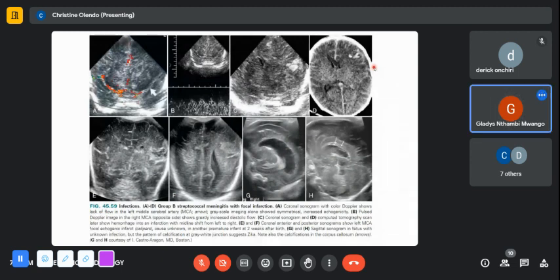Okay, shall we continue? What about E? All right, so in the area of the left MCA, there was a focal echogenic infarct that was visualized at this area. These are two different patients. And also F. There's also an echogenic area here at the parietal region, which was noted, and that area also signifies a left MCA infarct.